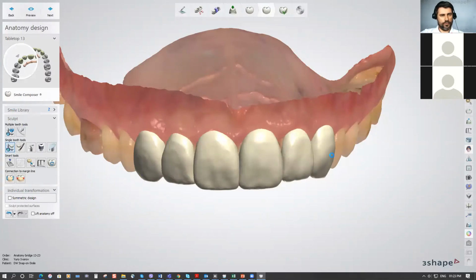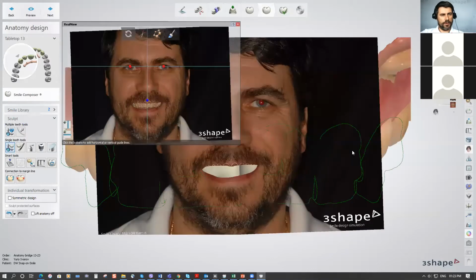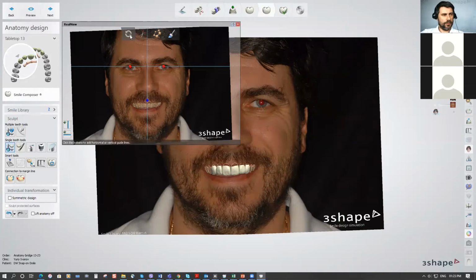I wanted to open it, and it will bring my picture over the 3D design, or 3D design over the picture. And we have the four steps workflow, with the very first one to define the, just to place the picture in the correct position.